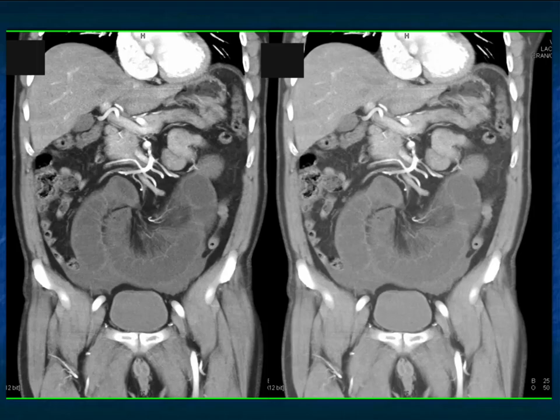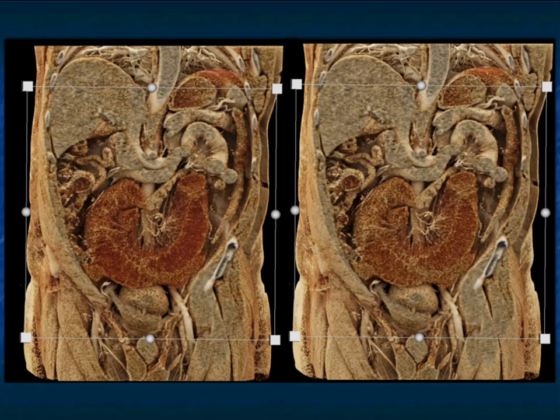And so you're dealing with an abnormal-looking SMA. It looks like the SMA is twisted. Then you see the small bowel is dilated. There's haziness of the mesentery. The vasa recta to the mesentery are very tiny and poorly visualized, and you see local inflammation. Beautifully shown also on the cinematic rendering, which accentuates the bowel that's ischemic as opposed to the normal bowel.